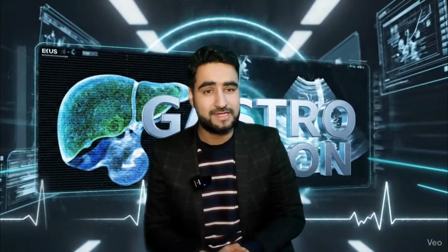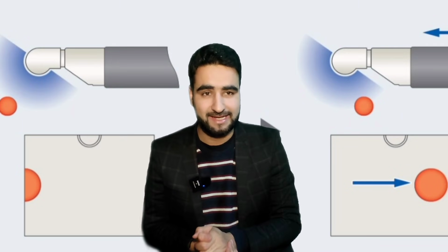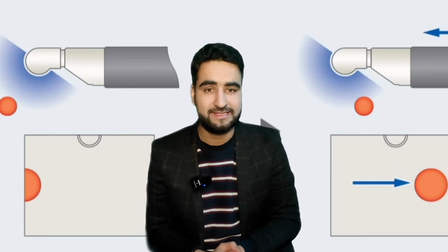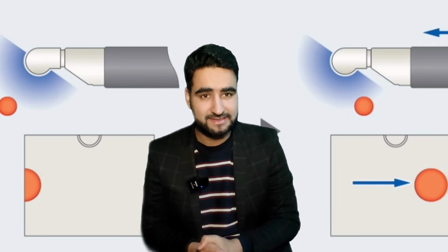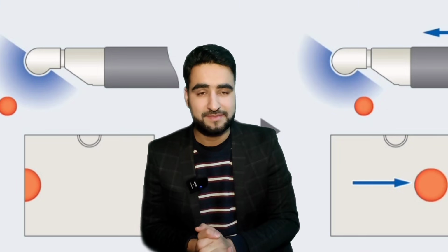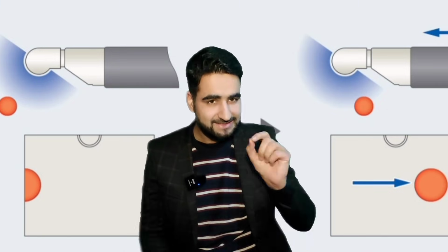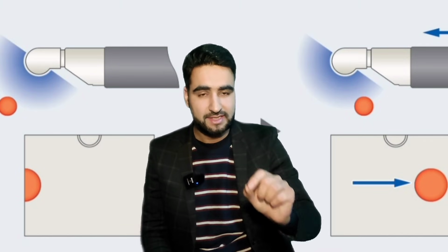Now let's talk about how the transducer's acoustic beams create your image. The transducer emits an acoustic beam across its surface. Think of your screen as a map. Structures captured by the caudal end, that is the tail end of the beam, appear on the left side of your screen. Structures that are captured by the cranial end of the beam appear on the right side of your screen. The practical implication is, as you advance your scope forward, targets move from left to right of your screen.